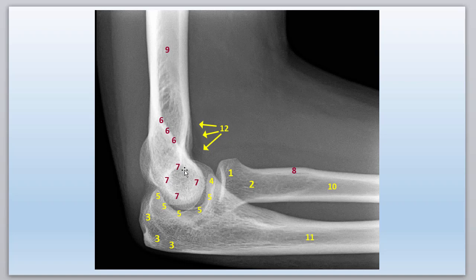That is the, why is my mind blanking? I just told you, capitulum. And that we said are superimposed supracondylar ridges. And that's the shaft of the humerus.